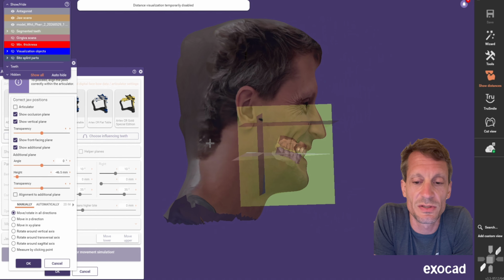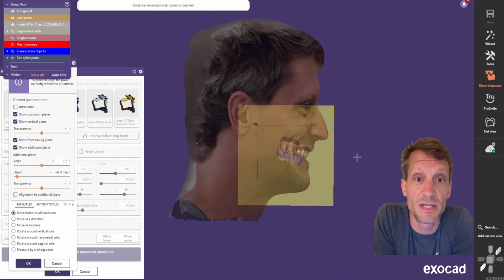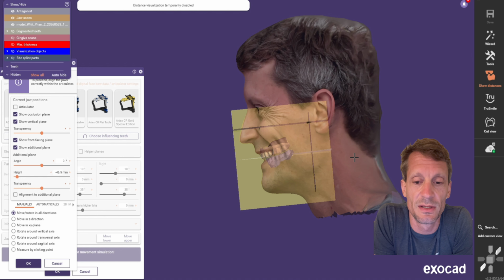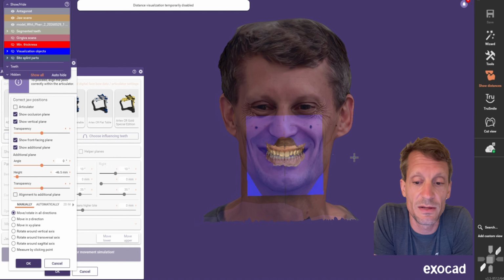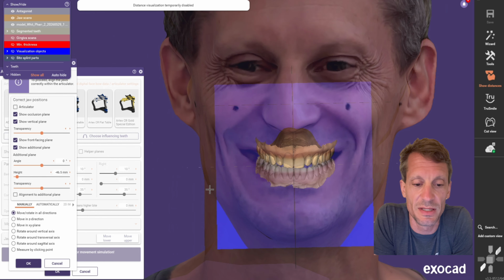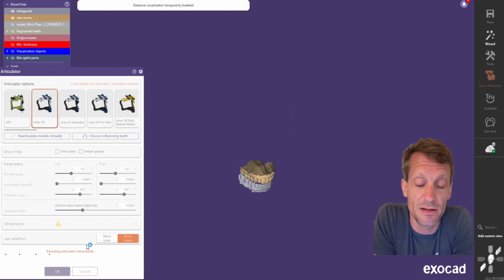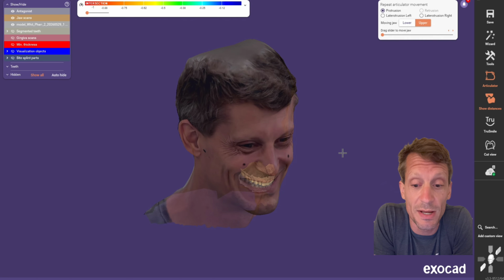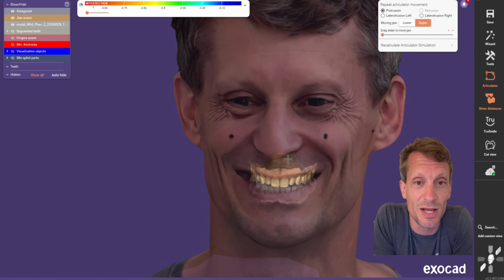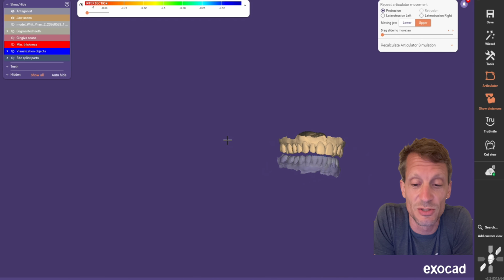And then of course you can also, I don't know if I do this in this video, but you can rotate to be looking straight down to confirm that the face is not rotated one way or the other, and it's going to be lined up in the articulator. So then now you have your true facebow mounting. I mean, this is no knobs to make errors on. To me, this is super fascinating.